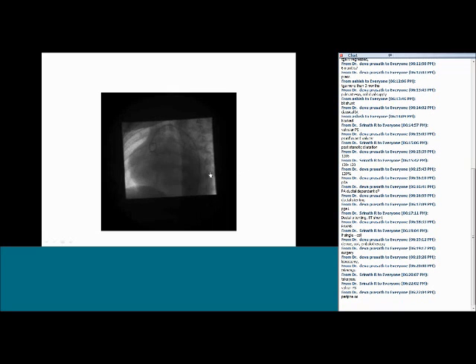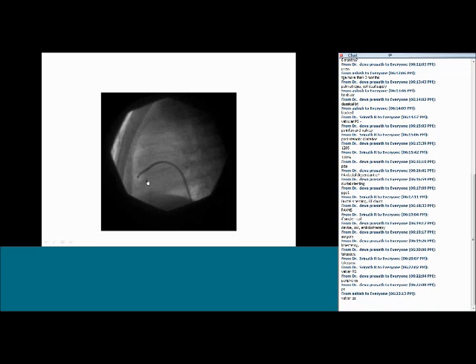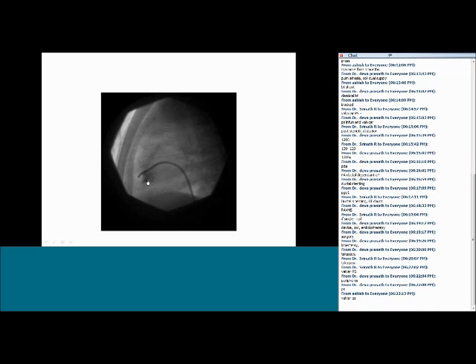No, both of you are wrong. Sorry. See carefully. Okay, please see carefully. It is not valvular pulmonary stenosis. It's not peripheral PS also. You can see the peripheral branch pulmonary arteries very nicely, and there is good vascularization of the lungs.